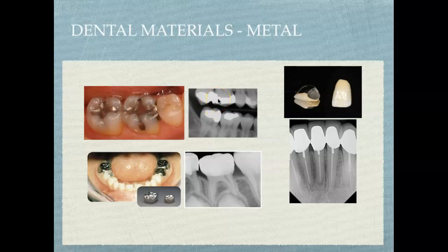Since stainless steel is a metal, this is what the radiographic image of a stainless steel crown would look like. Also, if you have any porcelain fused to metal crowns, they would also appear in this manner, and all of these are radiopaque. Okay, radiopaque. And again, this presentation is just about being able to recognize anything from what would be normal dental anatomy on a radiograph.